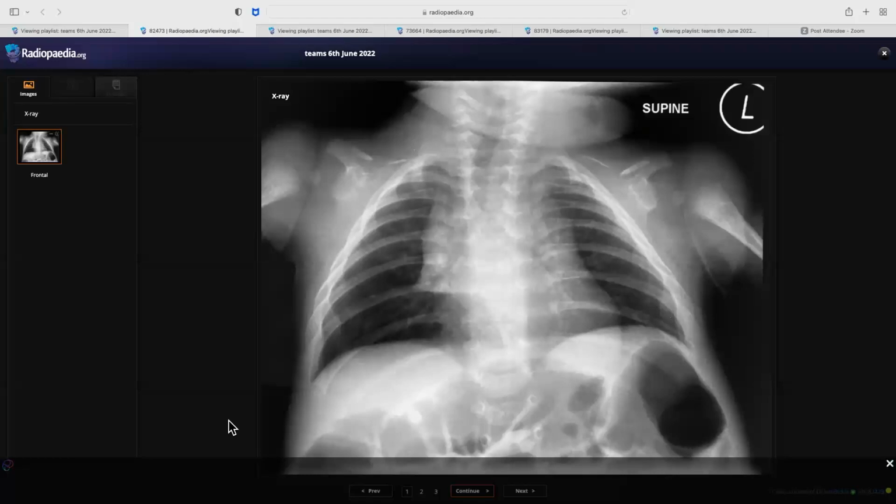Okay, I will go again. I will check my bones systematically. The ribs appear normal. The posterior ribs. So you are seeing. Okay. Yeah, I think there are some fractures I can see on the scapula. No, those shadows are just projectional. You can ignore them.